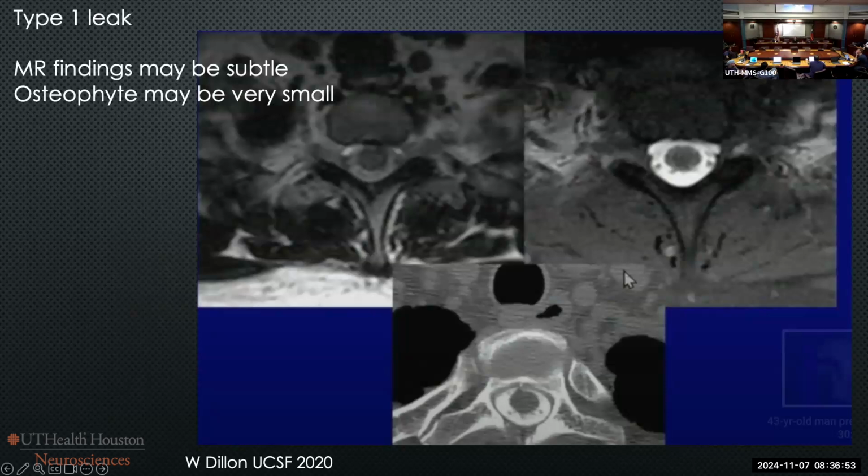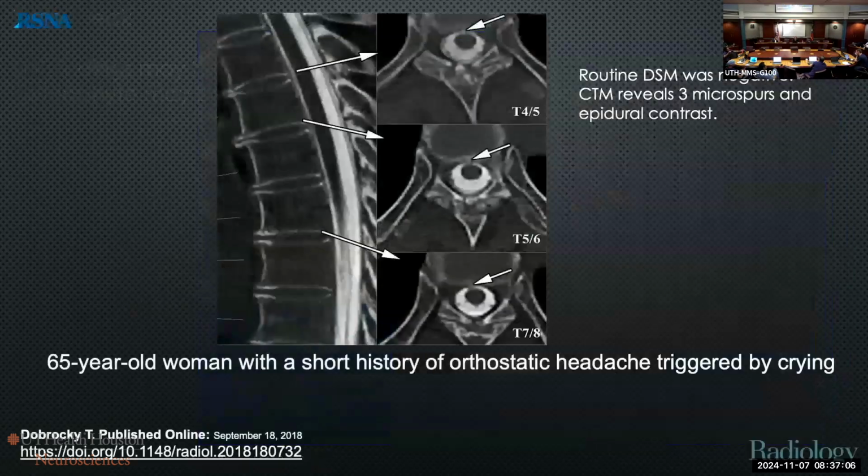Yeah, so we're always looking for this. He's looking for dog ears. And that can be very, very subtle, but it's quite apparent though. You don't need the 3D myelogram sequence to show that. That's true. So let's look at this case.